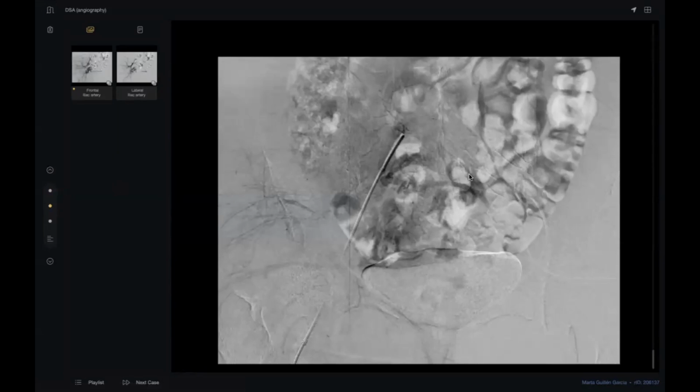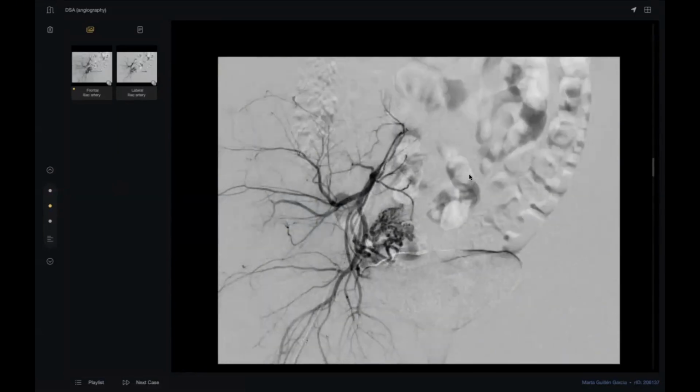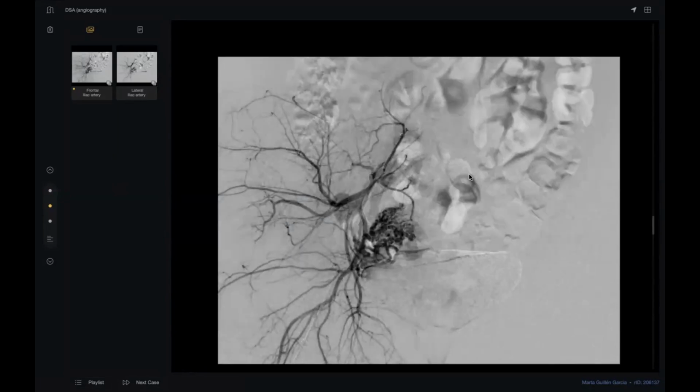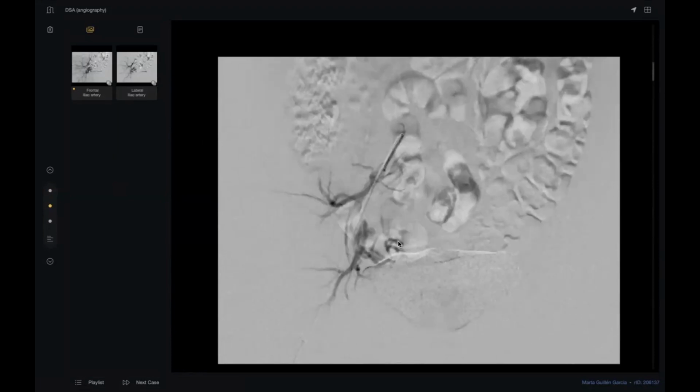Here, see? This is angiography of the internal iliac artery, or the posterior branch of the internal iliac artery. See here? The valve of the vein is very clear here. These dark dots are the valve. Okay, my colleagues? You are injecting the artery, so till now, arteries.